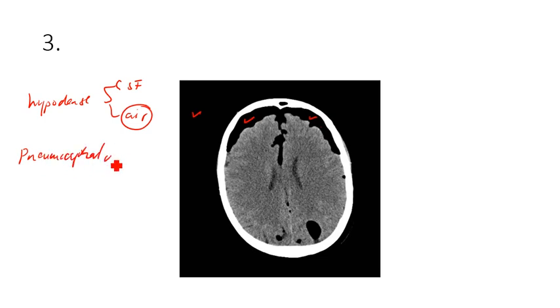Pneumocephalus is typically seen in traumatic patients or other infections that may be air forming, and typically we manage it with 100% oxygen. This is typically associated with trauma or some kind of infection that produces air, and so that's called pneumocephalus. Typically, we give 100% oxygen in this.